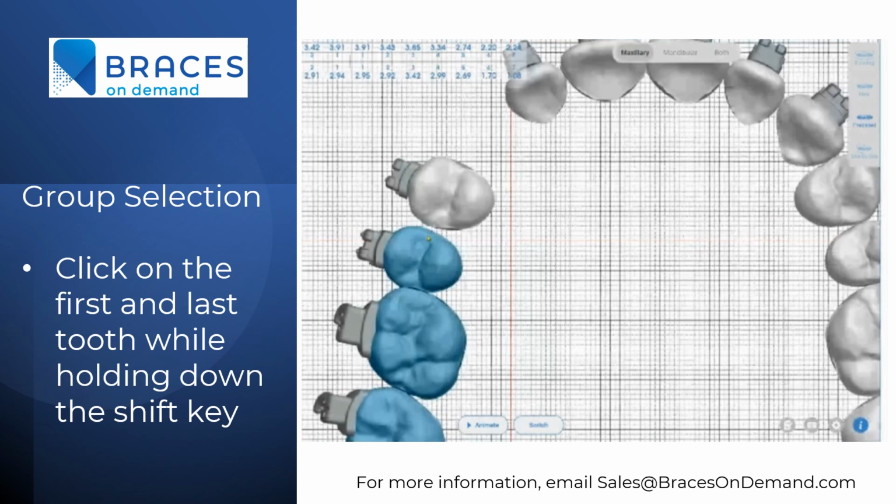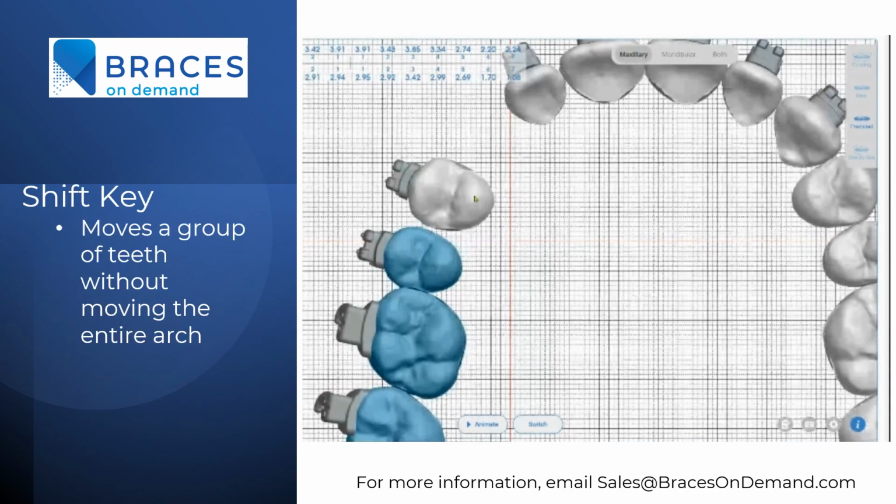So to select a group of teeth, you simply hit your Shift key, click on the first and last tooth, and you've selected your group. So we finally hit the part where we answer the question, why am I moving my entire arch when I only want to move that group? Well, once you've selected the group using your Shift key, keep holding the Shift key and use your right or left arrows to move that group mesially or distally.